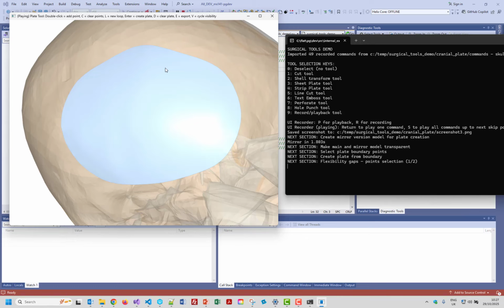Okay, so what was going on behind the scenes there was we created a curve, smoothed it, and imprinted it onto the surface, introducing new edges where the curve is, and then found all the faces inside that region, which created a base surface for the implant. Then we offset that to create a thickened surface, which gives us the actual solid material for the implant itself. Then we're going to do various smoothing, remeshing, and also add some bells and whistles.